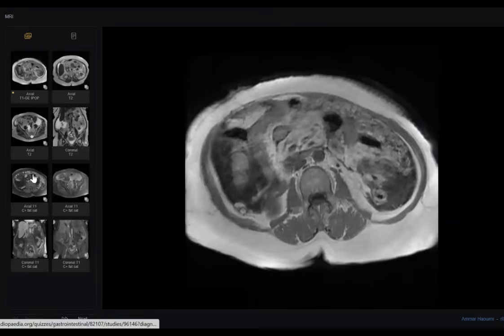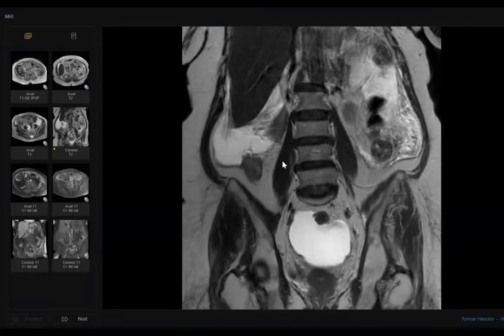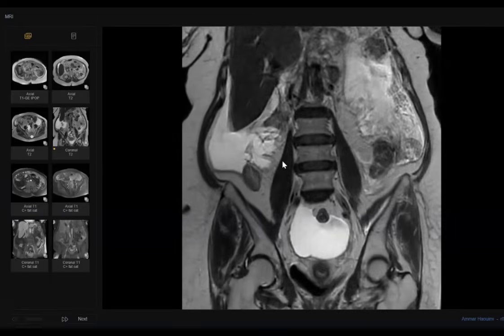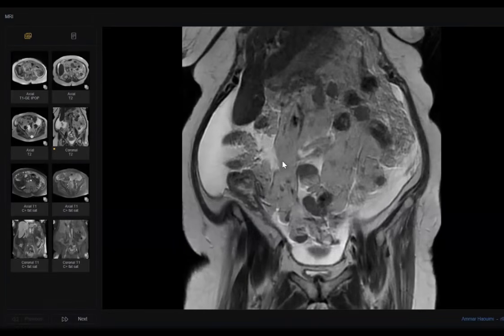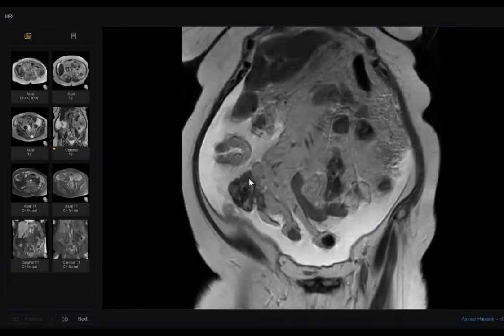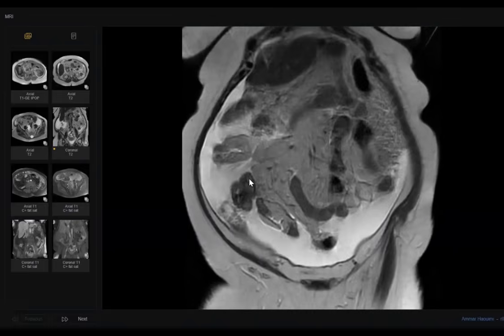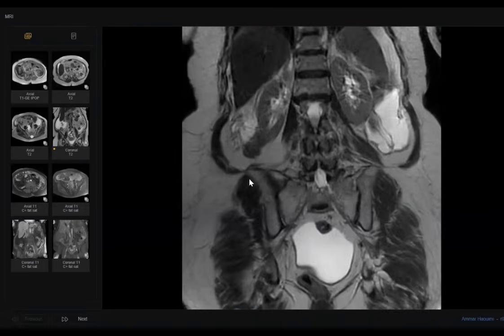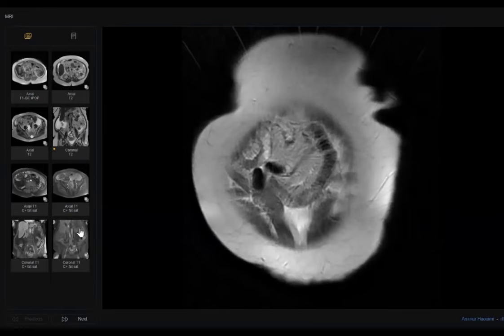By the way, here there is no cecal involvement, because the cecum and a part of the terminal ileum are very commonly affected. If you look here, the cecum is nearly normal. When I was preparing this case, the first thing I did was go to the cecum, and I found it normal. Then I went to the lung. Even the lung pathology is seen in only one sequence.